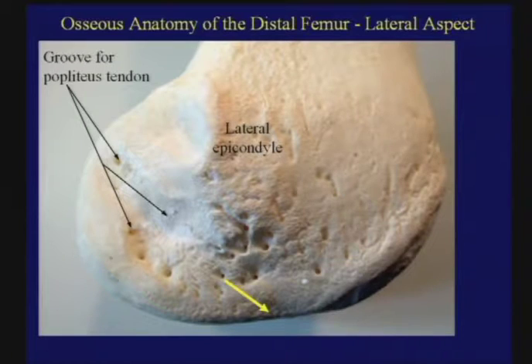On the lateral side, there is a considerable flattened area that divides the lateral femoral condyle into two equal halves. So this is, again, a sulcus between the weight-bearing condylar surface and the patellar surface, and in fact, both of these points are known as condylopatellar sulci. You all have seen this on radiographs. We sometimes call it the normal notch.